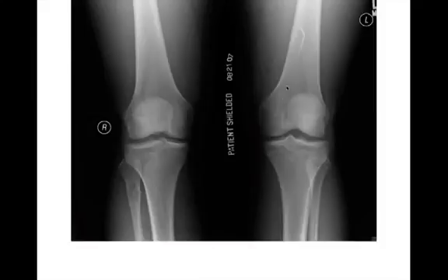This is another one, so we'll take this lesion right here to describe it, even though there's another one right here and probably another one right here. So geographic lytic lesion, narrow zone of transition, sclerotic border, which is eccentrically located in the metadiaphysis of the distal femur. There's no periosteal reaction. There's no pathological fracture. Typical appearance for a non-ossifying fibroma, right? So, assuming they're in the right age, if this patient were 80, I'd maybe think about it a little longer. There's another one right here. So this was a patient with Jaffe Campanacci and multiple non-ossifying fibromas.